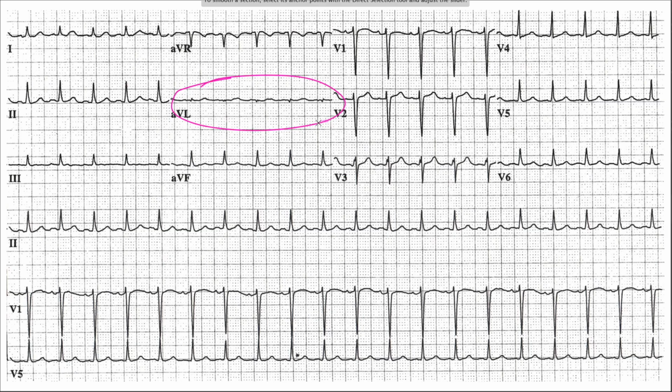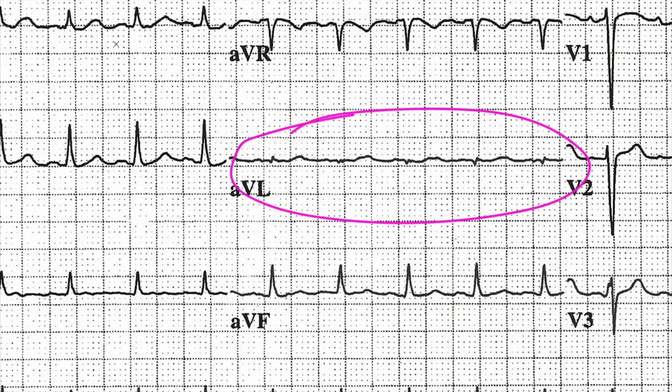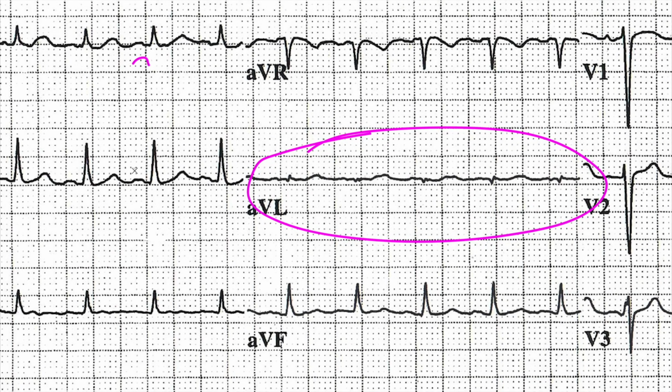Okie dokie. Now, I want to see that this indeed is sinus tachycardia. That is, it's coming from the SA node. Looking at this, the P wave in lead 1 is upright. The P wave in lead 2 is upright. In lead 3, I cannot really see it. It's upright in AVF. And a nice bonus, this is enough to confirm that this is coming from the sinoatrial node. It's inverted in AVR. That's an added bonus. So this right here in a quick setting would be enough to tell you that this indeed is coming from the sinoatrial node. However, these three, much better confirmation.